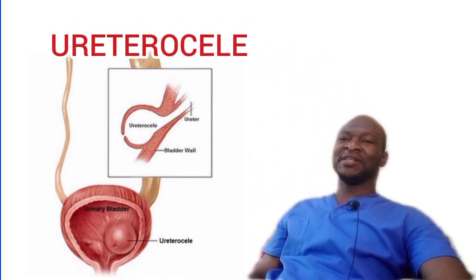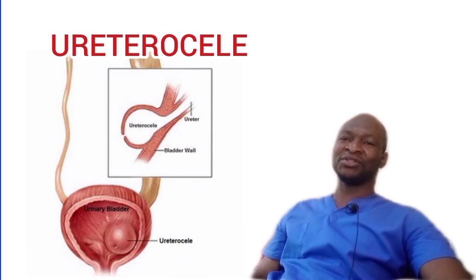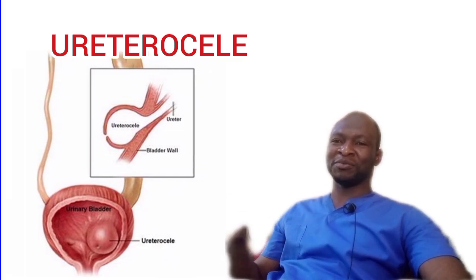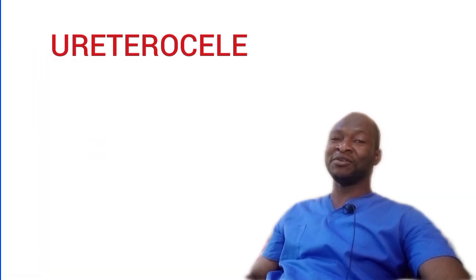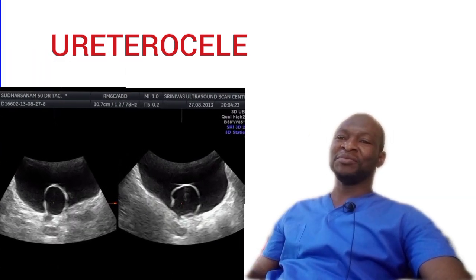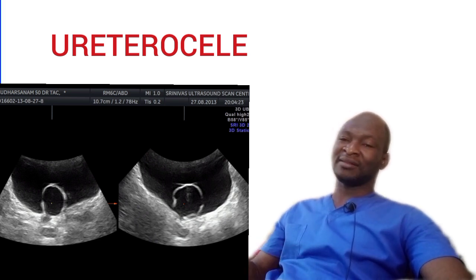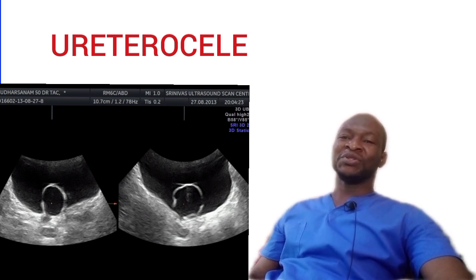Let's do a quick one on ureterocele. This is a cystic outpouching of the distal ureter into the urinary bladder. It results from a spectrum of abnormal embryogenesis, which is associated with anomalous development of the intravesical ureter, the kidney and the collecting system. Ureteroceles may be unilateral or bilateral, and may be symptomatic and present with a wide range of clinical signs and symptoms, from recurrent cystitis, bladder outlet obstruction, hydronephrosis, or renal failure. May be associated with a normal, well-functioning kidney to a non-functional dysplastic kidney.